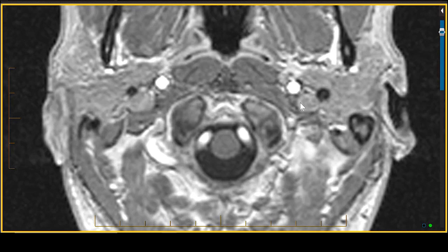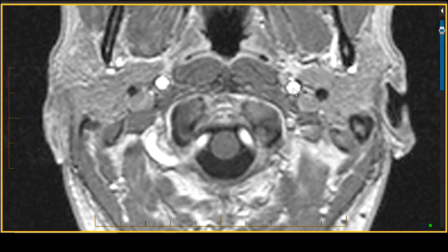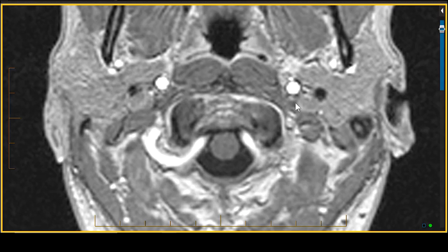Now I'm going to go as low as I can. I've got the internal carotid artery. I can't see the external branches all that well, and I'm not down to the level of the common carotid artery yet, but that's relevant. So keep these two structures in mind.